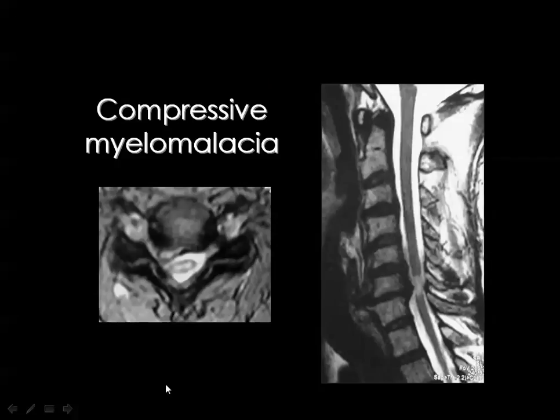Then in the MRI, we just say that there is a big disc, and in this axial image we know that this disc is a herniation because it's focal and to the right side, encroaching on the foramen, compressing the cord. Then we say that there is a C6-7 right posterolateral disc herniation with significant cord compression at that level. How did we know that this is significant?